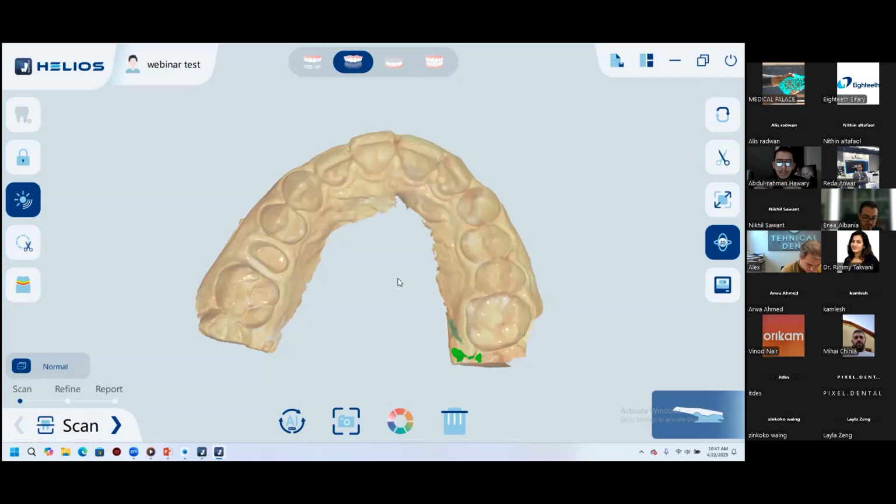So it does not directly increase the accuracy. The maximum amount of deviation is still 20 microns, but the stability of the accuracy within the whole scan is now higher, so the possibility of reaching the 20 microns is less. Also, the possibility of having a very slow scan is less. So the overall smoothness and scanning speed is better.